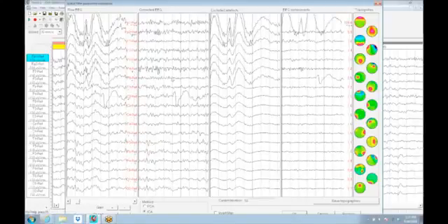everybody can probably recognize this little culprit here at C3, the C3 electrode pop. And that electrode pop is a discrete focal C3 component, and you can see here it is. If we select it, it takes out that C3 component, leaving quite a bit of the C3 activity.